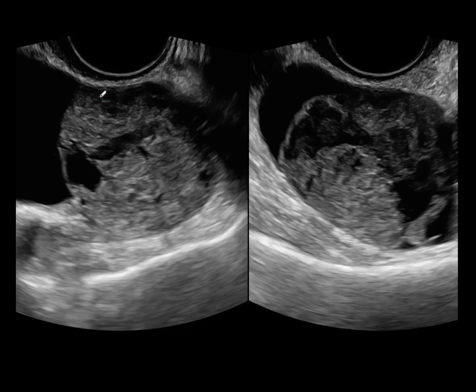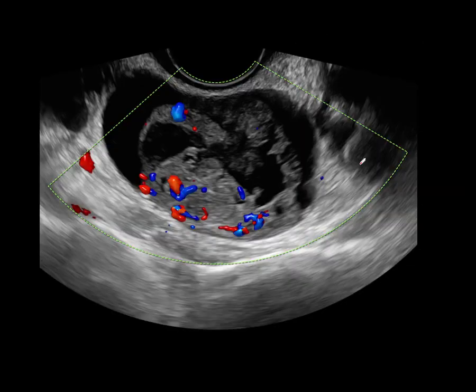Here's another patient again with something which could be construed as being clot. We're not seeing that border very well over there, but certainly this part here looks nice and smooth. Solid mass internally. It could just be blood clot from a hemorrhagic cyst, but when we look at the colour flow we can see that there's convincing flow in here, and this was a malignant tumour.